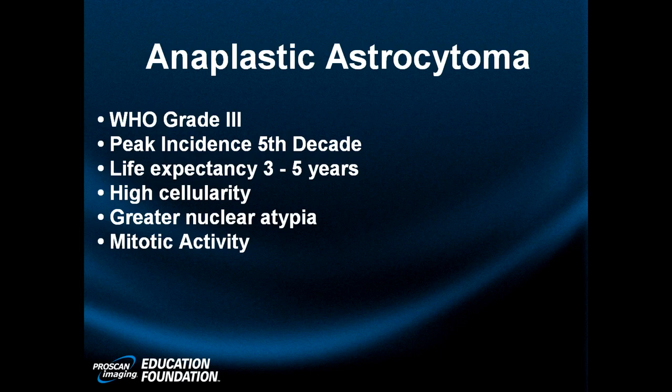First thing is, tumor's not enhancing anymore, but it hasn't shrunk. It's the same size. So the enhancement's gone away. Or let's say the tumor did shrink, and the enhancement's gone away, but the choline peak is rising, and the lactate lipid peak is rising, and the diffusion is worsening, and the ADC map is showing worsened diffusivity. Now think about it for a minute. If you are killing something, there should be more diffusion, more mixing, more liquefaction. But if that is not happening, that means that the tumor is actually progressing.